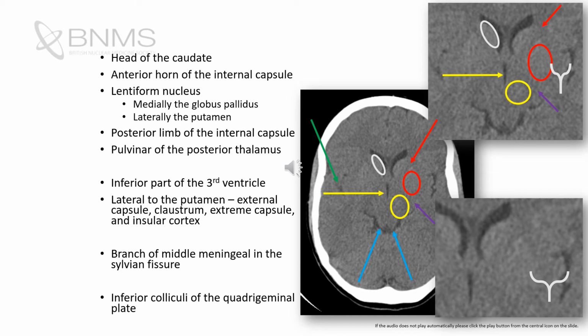On this slide, we see both the complete view of the brain, and if you click, you will see a magnified view of the central brain structures. Click again, and the two white ovals show the position of the head of the right caudate nucleus.